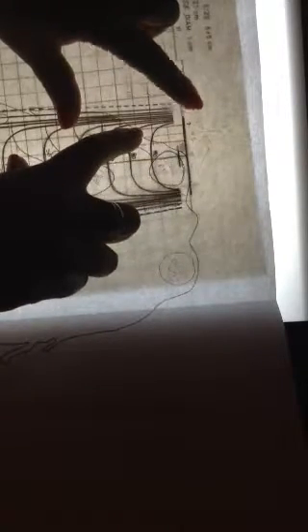Took my ruler and measured each of the segments and multiplied those amounts by 0.67. So over here in the margin, you can see my segment number 1. I measured at 1.3 cm, multiplied that by 0.67 and got 0.871, and did the same for the other segments.